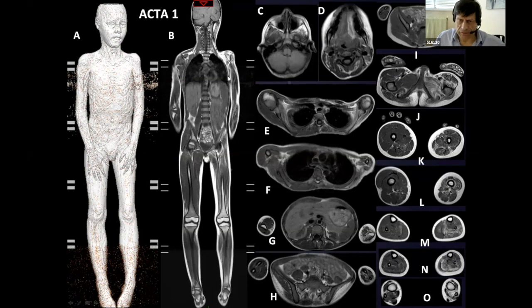But in this case, you have an explanation in the genetic profile of the patient. And as you can see, you can detect asymmetry in bone, with morphological adaptive modification in bone.